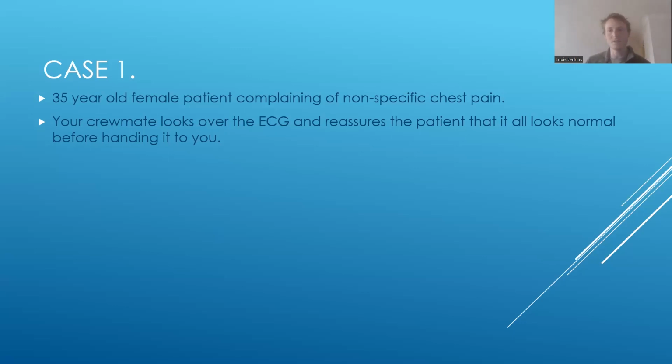And I would encourage you to maybe pause the video a little bit, take some time to have a look at the ECG and come up with your own thoughts about it. And then I'll go through my interpretation, and then there'll be some slides afterwards about why I've come to the conclusions I've come to, and we'll be linking each case hopefully to some of those rules that we mentioned previously.